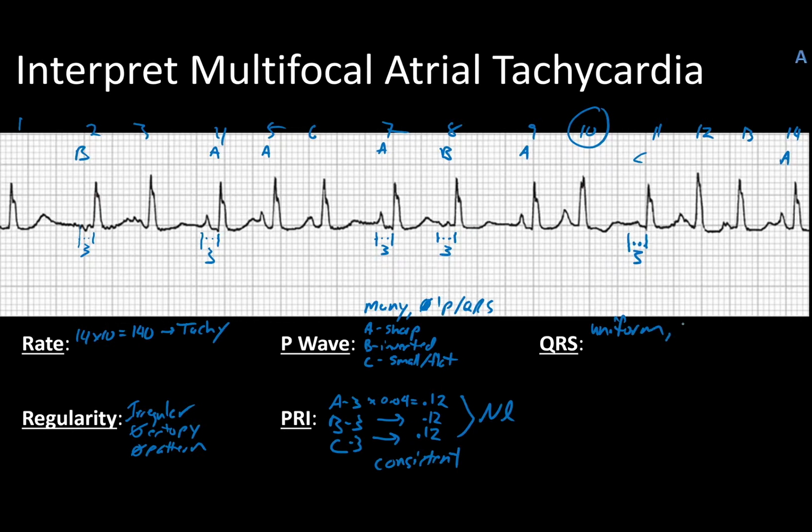They have the same pattern of R prime. Actually, one, two, three, four. Actually, let's scratch that. It's actually R prime, because it's less than half. It varies a little bit throughout here, but we'll say the R prime.